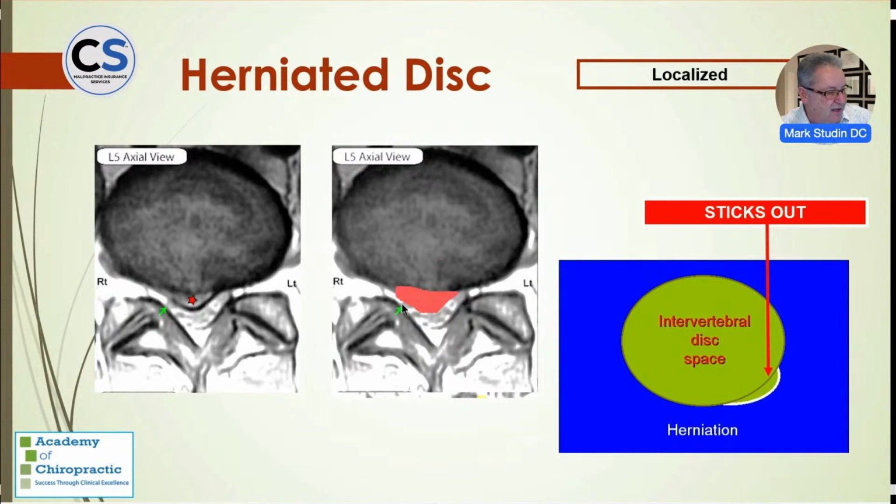between the herniated disc and the ligamentum flava, and it's catching, you see this green line here on the right, L5, it's catching the L5S1 nerve root as it's exiting. It's very simple. You get to see all these things and see why. This is on the right side. MRI is read right and left. It's reverse. And on every image, you'll see right and left.